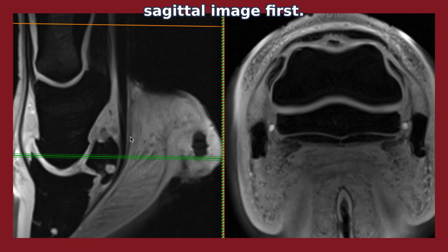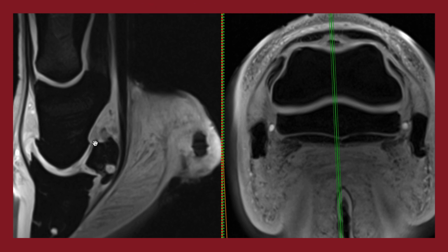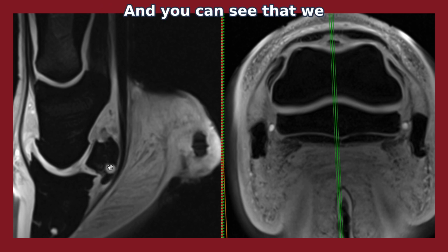We're going to look at the sagittal image first. As I scroll backwards and forwards, the green line is going to show you where we are from medial to lateral, and then we'll look at the transverse images, and the green line will go into the sagittal image and show you where we are. At the moment, we're on sagittal midline. The navicular bone is all black because we were on a fat suppressed image, so we don't see the medullary fat. And you can see that we have a very bright circular lesion within the flexor cortex of the bone.